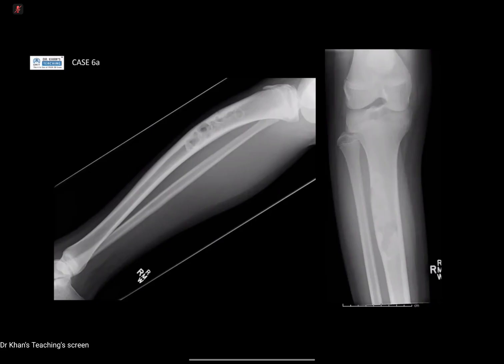So it has caused a bowing of the tibia. Had the patient inherited a skeletally deformed bone, I would say the lesion is non-aggressive because I cannot see any periosteal reaction or soft tissue swelling. There's a narrow zone of transition. I can see the inferior lateral borders, the inferior medial borders, the superior borders. Yeah, good. Okay. So you're not seeing any aggressive features.